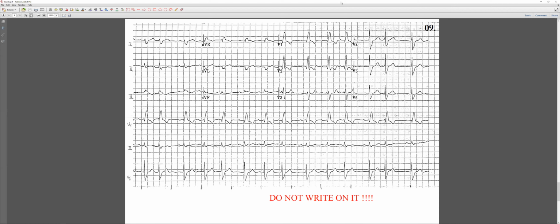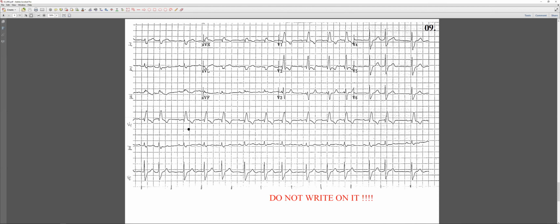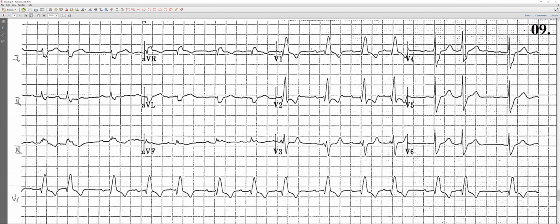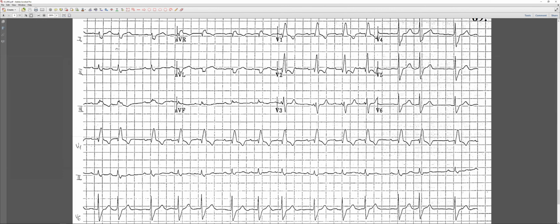So is there a P wave? Yes, you can magnify it. Why don't you use the plus and the negative side? I will magnify here. Come here and plus, plus, plus. Oh, I didn't see. Okay, that's a lot easier.